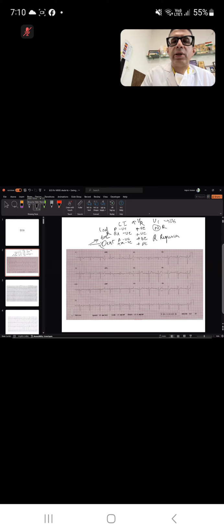When you have severe right ventricular forces which is producing it, then in this case, P wave is normal. So in L1, P wave is positive, QRS is negative. In aVR, P wave is negative, and QRS is positive, okay? And R wave regression is again there.